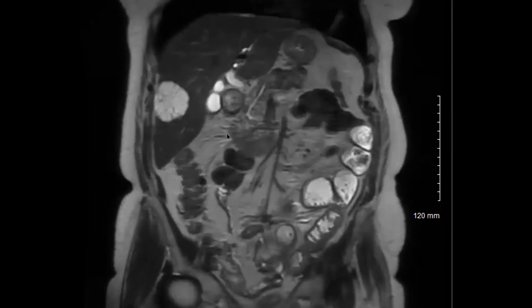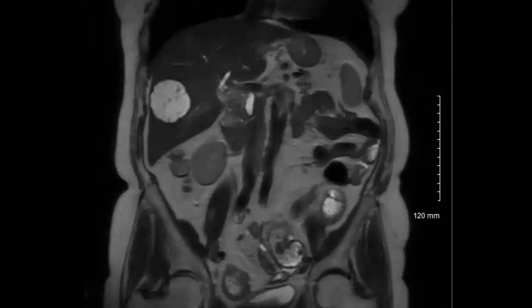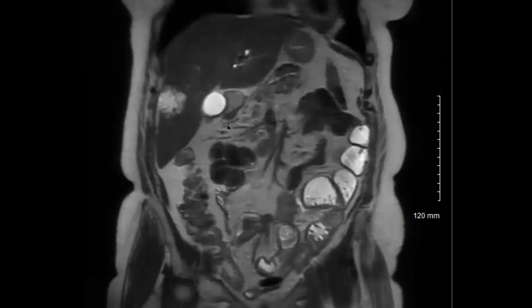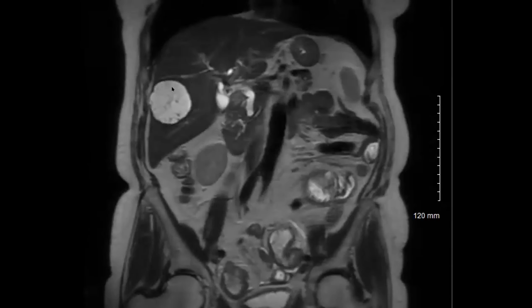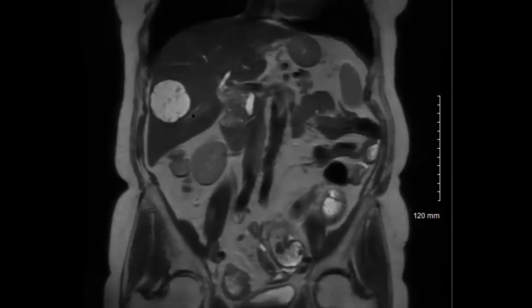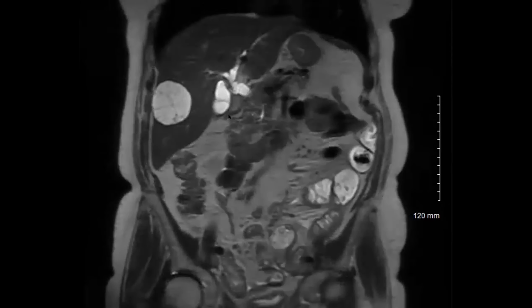But for IPNB, I don't think you always see the communication, because there are a couple of types, and one is called the cystic type. Yeah. And it doesn't necessarily look like it's forming along the bile duct or communicating. Right. But those tend to be in the vicinity, at least. And this one is far away in the periphery. Also, this is the right lobe. I read commonly that MCNs are more common in the left, but I don't know how often they follow that rule.